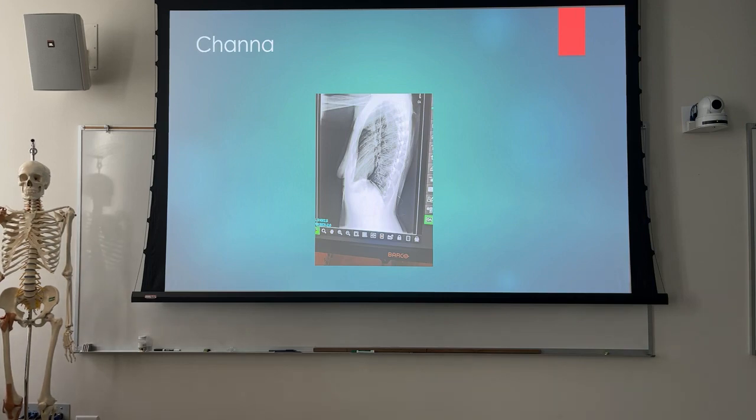I think here's the first images that I got, and that was like 3 weeks ago. So I certainly would get the arms up a little bit and possibly get rid of some of the abdomen. I think this was a language barrier. Oh, yeah? Yeah, so I was trying to tell her how to. That introduces a whole different level of issues.